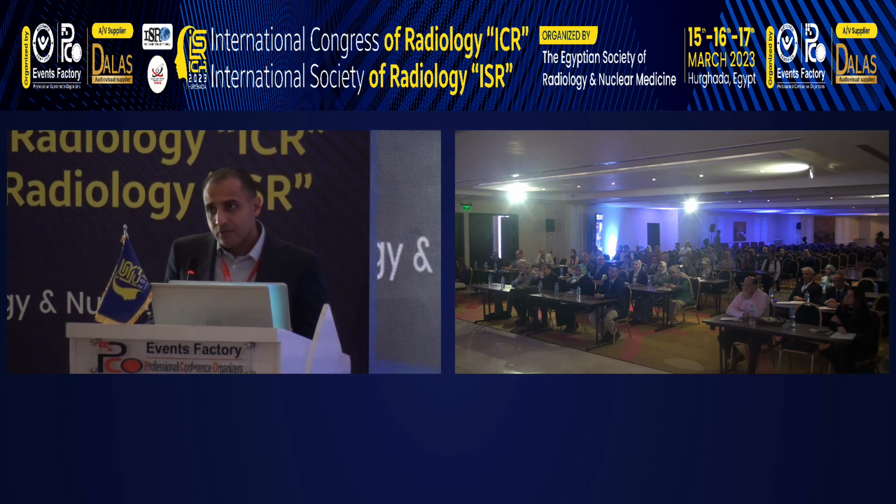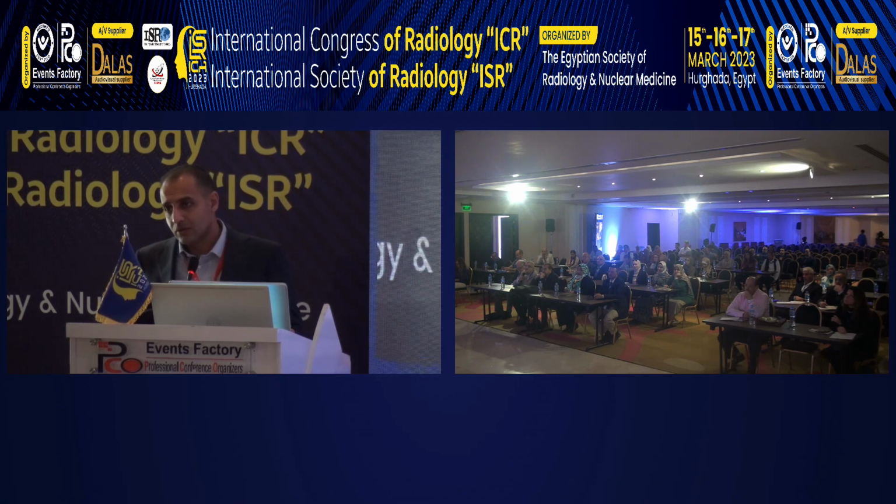In inflammatory arthropathy, whether related to an autoimmune condition or an infectious process, I would always see effusion of the shoulder. But in frozen shoulder, there will be only mild effusion. The hallmark is that you don't have, for example, pus; it's not an infectious process inside the joint. The capsule itself is thickened, so the joint effusion will be less. Second, if I suspect an infectious process, I would recommend aspiration, apart from any clinical scenario.